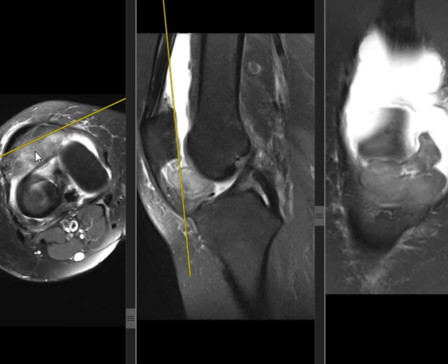One point, it should be hyperintense on T1 and suppressed, which is not the case here. And I'll give you another hint: intraoperatively the lesion was bloodless. Not a drop of blood came out when they removed it. Cartilage? Synovial what, like synovial chondromatosis? First you said it's not arising from the cartilage. So from synovial. Let's stay with our original conclusion.